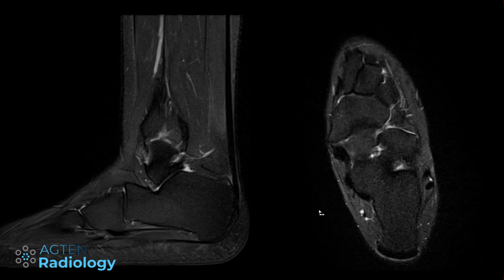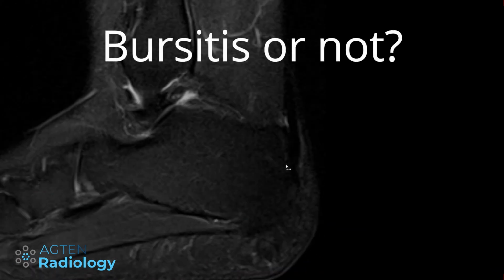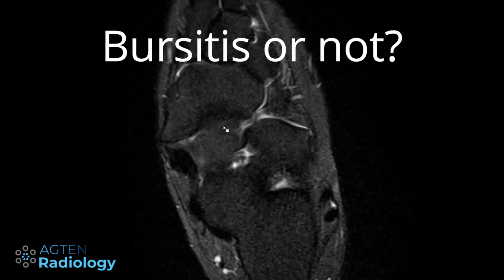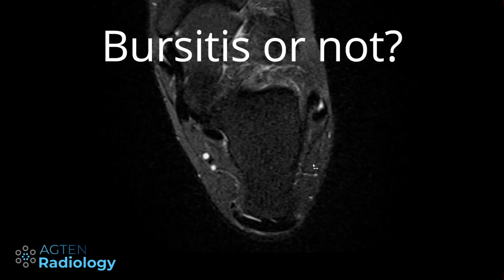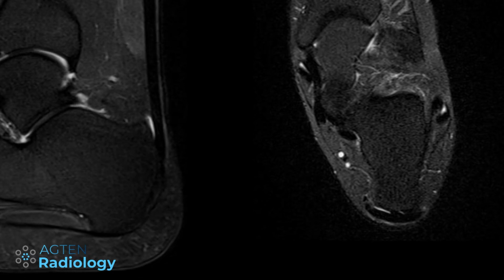So I will scroll through slowly here, making this one bigger. Also show you the transverse sections here. Okay, we will come back to this case later.